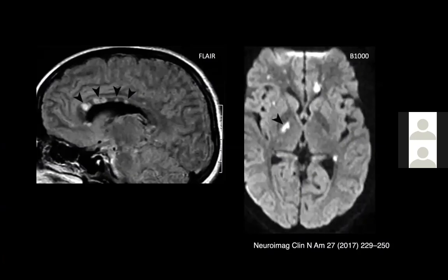Here you can see there is a lesion within the corpus callosum, in the center of the corpus callosum, involving the entire width of the corpus callosum in the genu, in the body, and in the posterior body. And then there is a long lesion in the posterior limb of the internal capsule here.